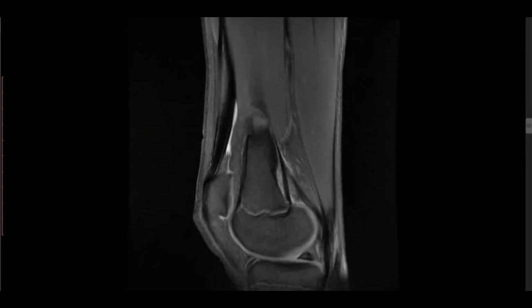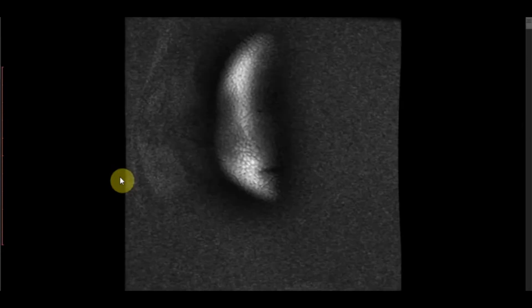So this is the cortical desmoid, and they are generally discovered incidentally. So this MR was performed for osteochondroma, and the cortical desmoid is diagnosed incidentally on this. And they are generally seen in adolescent people. So this patient is also 15-year-old, and we can note the presence of cortical desmoid in this MRI. Let's move to the next case.